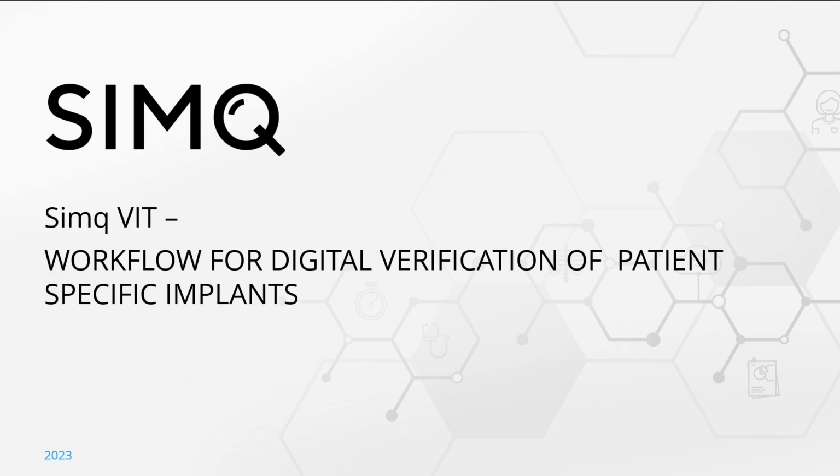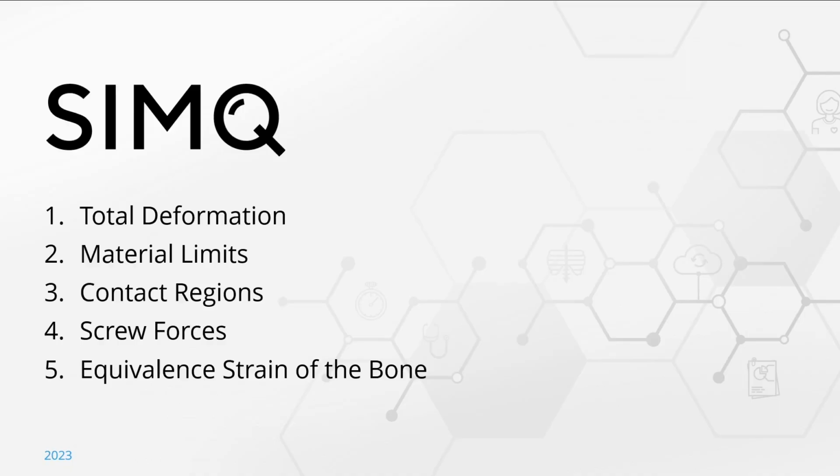The features we will be discussing today are 1. Total deformation, 2. Material limits, 3. Contact regions, 4. Screw forces, 5. Equivalent strain of the bone.